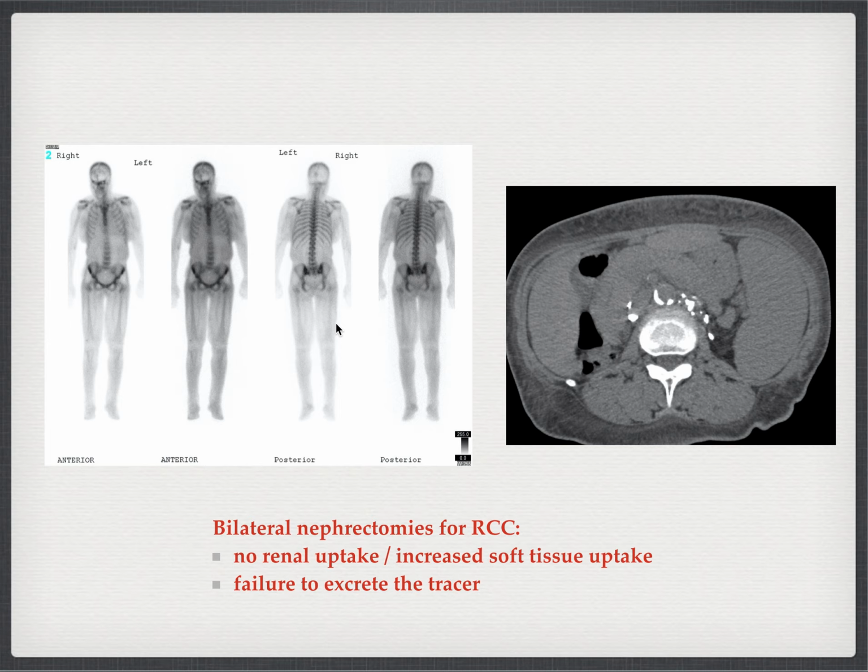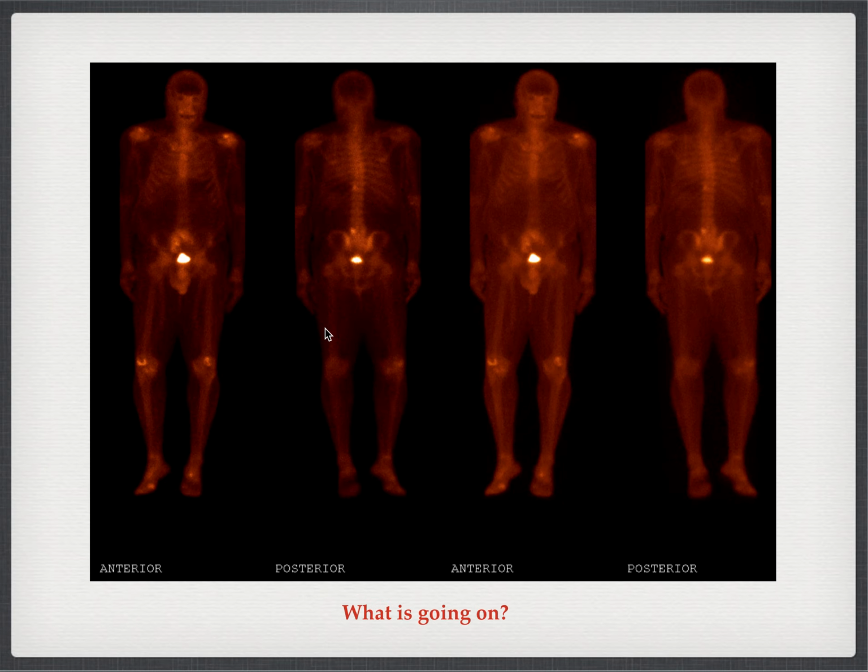And this is why in a typical patient, we try to wait for 3 to 6 hours for the tracer to be cleared by the kidneys. In this case, it's not possible. So our best bet is to try to do some delays to see the skeleton.